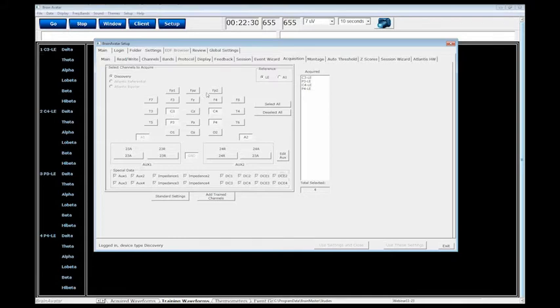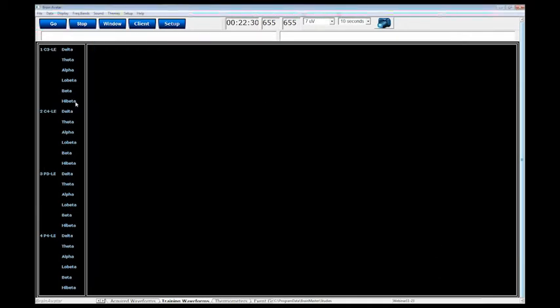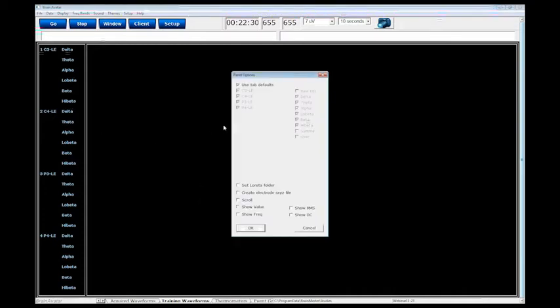But as some people have asked me, they do want to sometimes look at data in a different order, and that is actually based on how the montage is. So on the training waveform screen, if I right-click, you're going to see most of the same controls as you did on the acquisition. There is a little bit extra, which has some features of basically being able to export to the S-Loretta software, and that is with these ones right here.